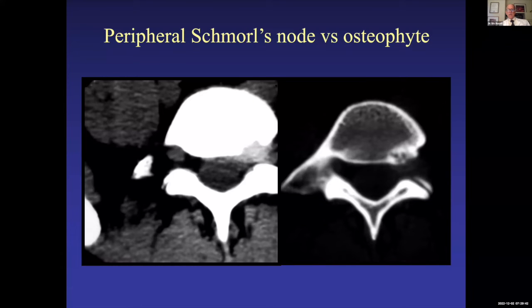Here's a CAT scan. You can see the herniated disc on the left compressing the nerve root, and there's a defect in the end plate next to it. So if you didn't know if the patient had an acute problem or a chronic problem, you could say, hey, this is just osteophytic spurring around a chronic disc herniation. But if this patient had an acute injury, this could be an acute peripheral Schmorl's node associated with an acute disc herniation. And on CT, hard to tell. On MR, perhaps edema in the vertebral body might distinguish. So sometimes it may be hard to tell in a case like this.